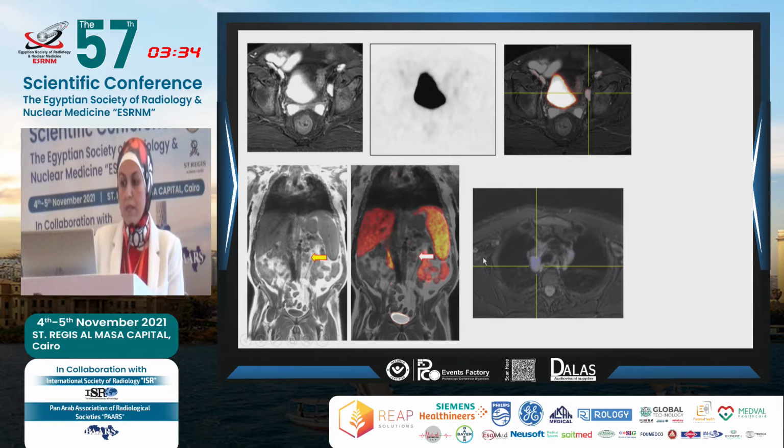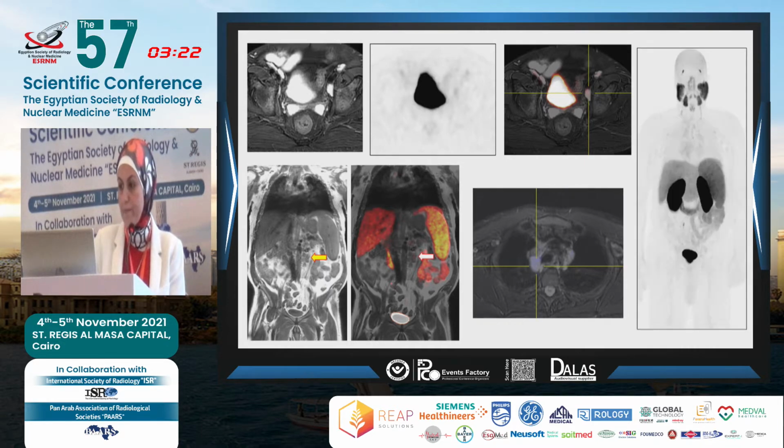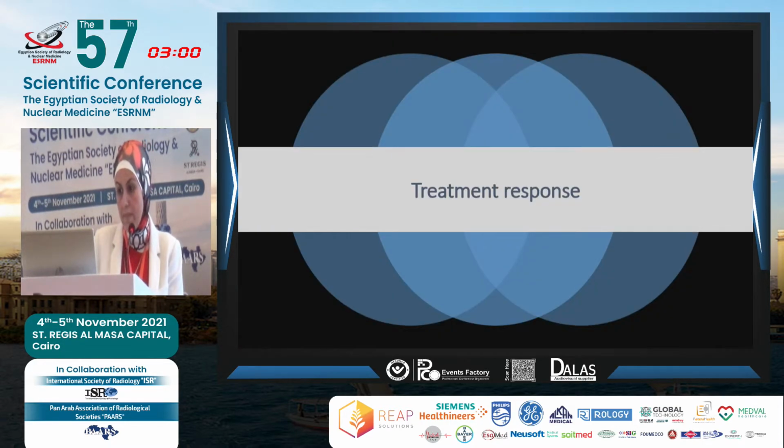And another mediastinal lymph nodes, which appear also to be equivocal on the conventional image to be metastatic lymph nodes, but they are completely negative. And this is completely different from the primary prostatic tumor. This is the PET MRI imaging for the patient with no distant avid lymph nodes uptake, and we suggested that these lymph nodes are due to other pathology, either sarcoidosis or just chronic inflammatory status, and pathologists are still pending for characterizing these lymph nodes.